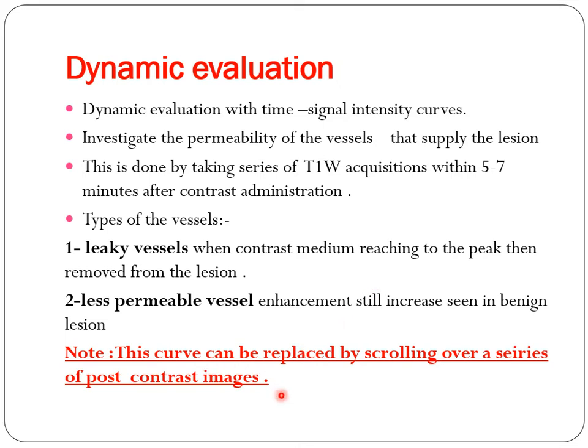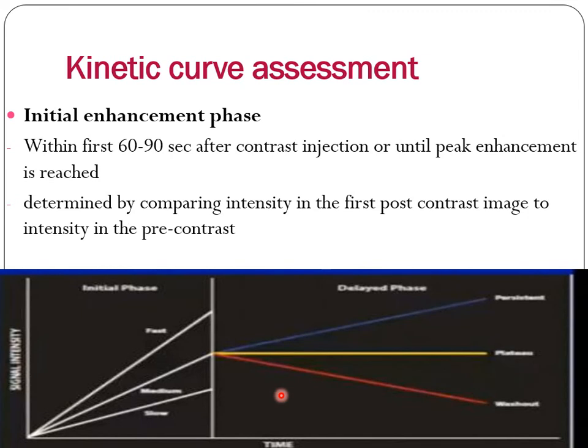This curve can be replaced by scrolling over a series of the post-contrast images. It means that you can depend on scrolling over the series of images taken after contrast administration. Here is the kinetic curve assessment.